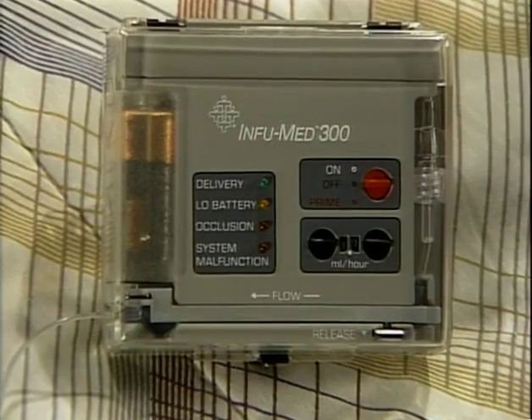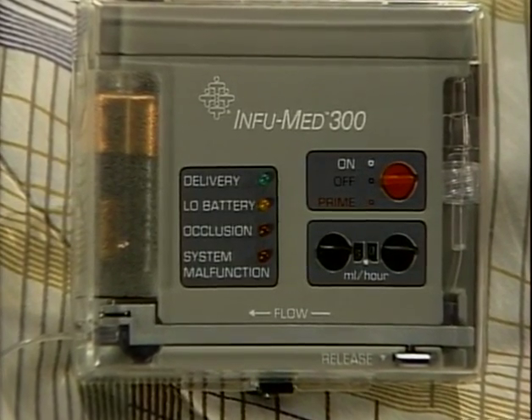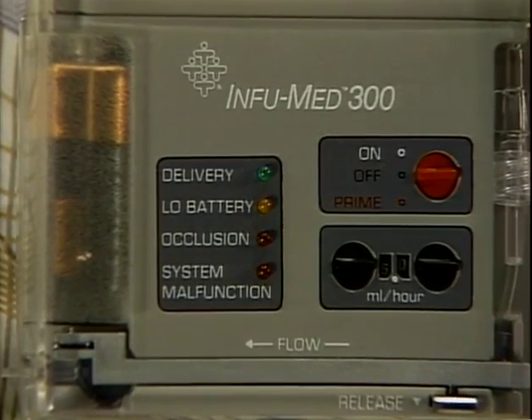Recent advances in technology and the development of pumps allow patients to be treated at home for many conditions which would have required hospitalization in the 60s. While most high-tech pump therapy today follows an early discharge from the hospital, more is being initiated following an outpatient assessment or procedure, as an alternative to hospitalization.